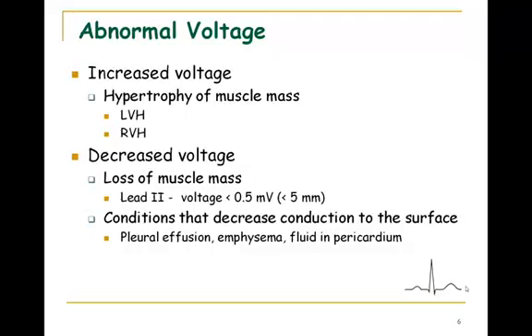It depends on how much muscle mass you lose; it may not be as evident on an EKG unless someone lost enough. Generally, as a rule, if the overall voltage in lead 2 is less than 0.5 millivolts, that is considered a low voltage ECG. That would correspond to less than 5 millimeters in height.